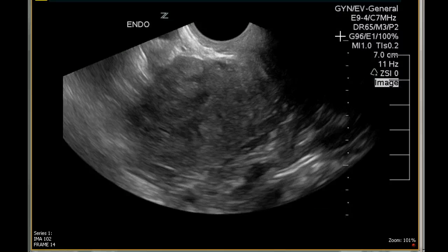I don't have her actual last menstrual period, but the SRU guidelines make it pretty easy on us. If there's a postmenopausal cyst, unilocular anechoic, in a postmenopausal patient and it's over 1 centimeter, we're going to recommend a 1-year follow-up.